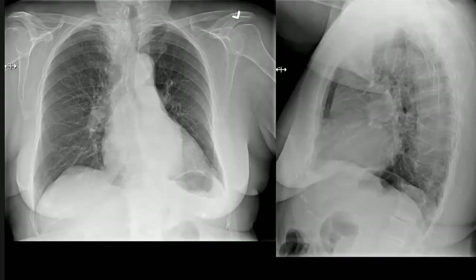Okay, so I'm provided with a frontal and lateral radiograph of an adult female patient. I'm starting from the center. The trachea is slightly shifted towards the left side, and there is an asymmetric radiopacity in the right paratracheal region. The bifurcation is okay. The heart size appears slightly enlarged and slightly more towards the left side. Also, the left lung volume appears slightly reduced as compared to the right side.